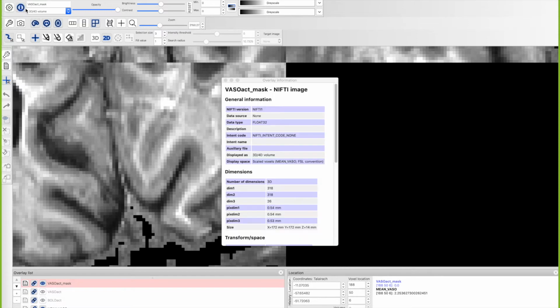So it basically copies the name of the previously top part of the queue here and adds mask to it. Now we can have a new data set that has the same dimensions, with the same resolution, same matrix size and everything. It's just empty. So as soon as I go through anything here, you might see that it's all just filled with zeros.